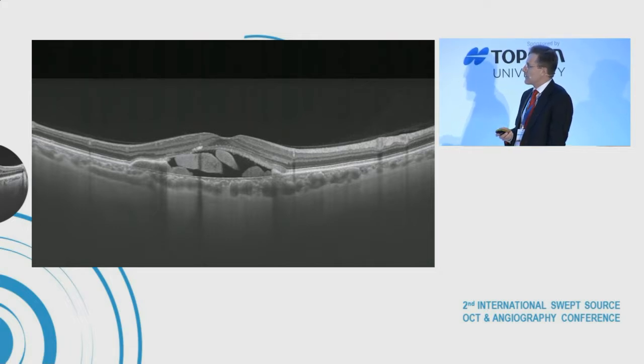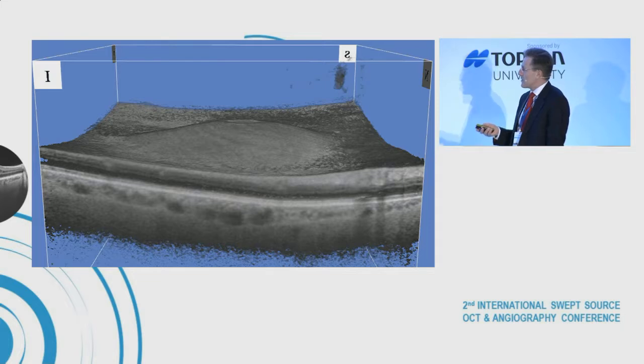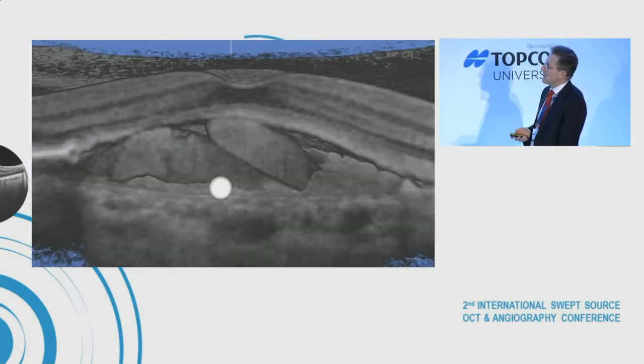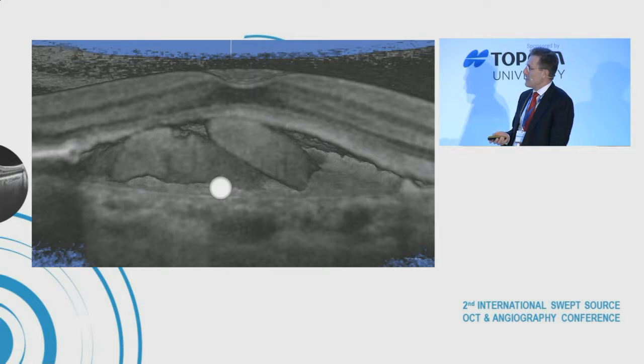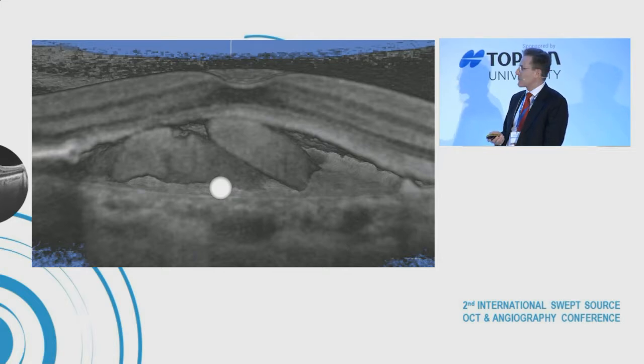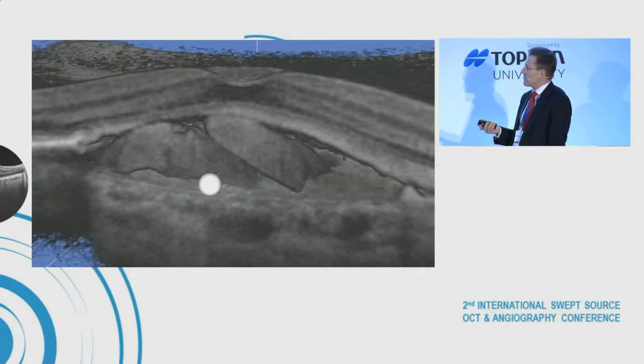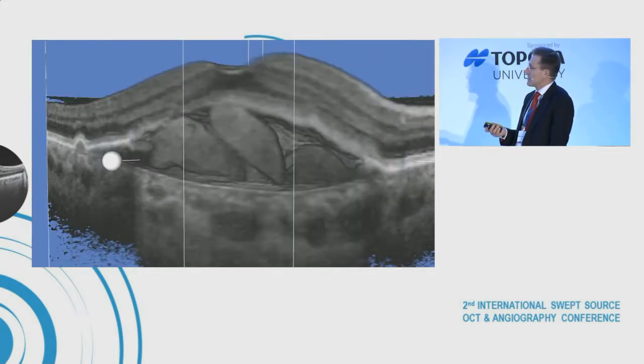And let's have a look at this again in 3D. Okay, see it first from the outside, and then we cut off half of the retina up to the fovea nearly, and here you have these big boulders of drusen, semi-detached, floating around after the pigment epithelium detached and ruptured, and they can be seen from different angles, as we have it here.